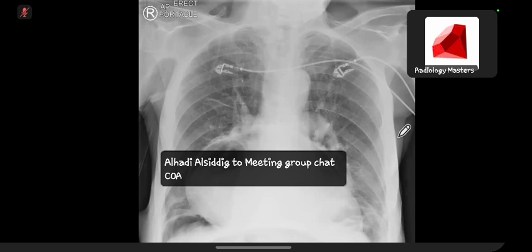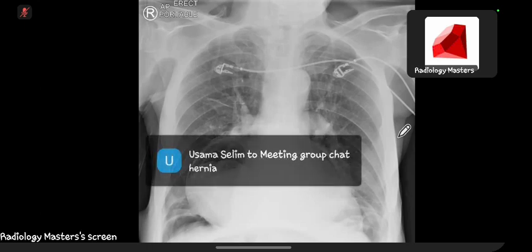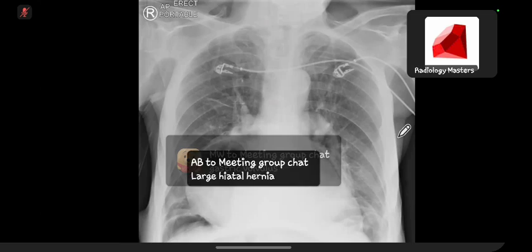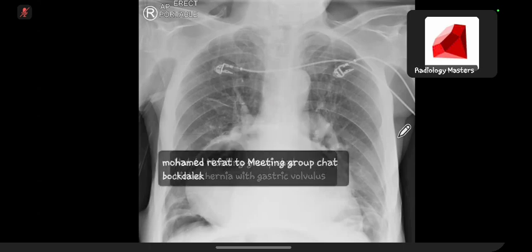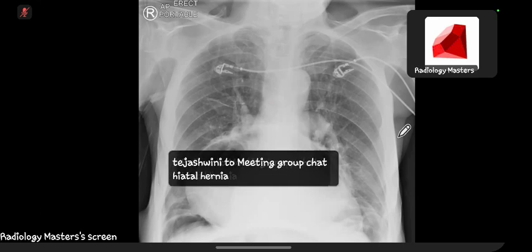Okay, this patient has got abdo pain. Yeah, there's hiatus hernia and there's free gas.